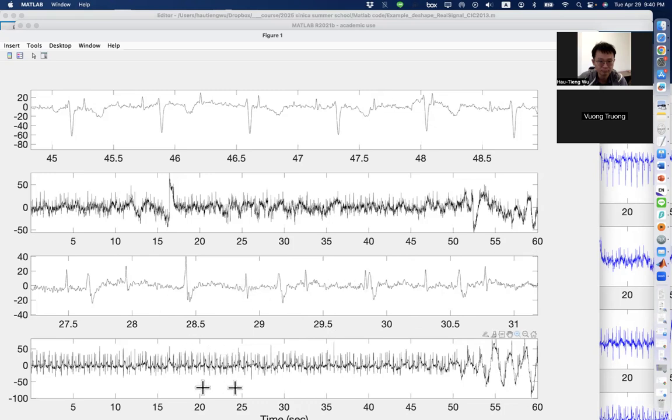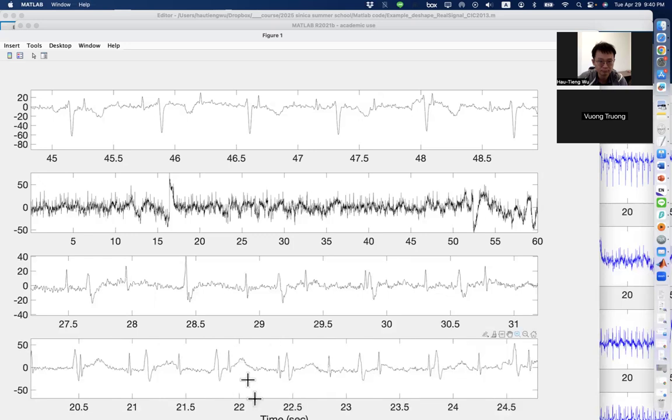And if you go here, then you see, oh, well, this is wider, so this is the maternal ECG, because PQRST and heart rate are somehow nonlinearly related. And this is the fetal heart rate, fetal ECG, which seems to beat faster. Okay, very good. So we have a very basic observation of the signal.